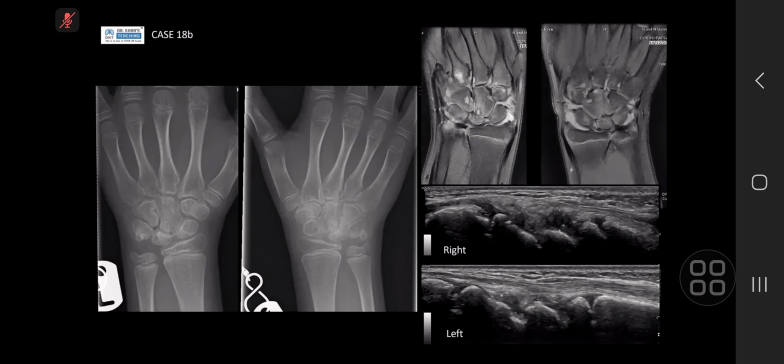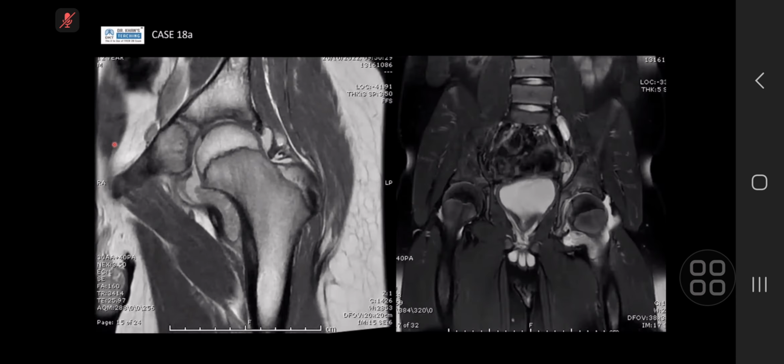Okay, and good. And if you're thinking of an inflammatory arthritis in kids, is it called rheumatoid? Juvenile rheumatoid arthritis occurs more with ankylosis. Yep. Okay. Good. So well done. So MRI of the hip, T1 and T2 STIR, and nicely picked up.